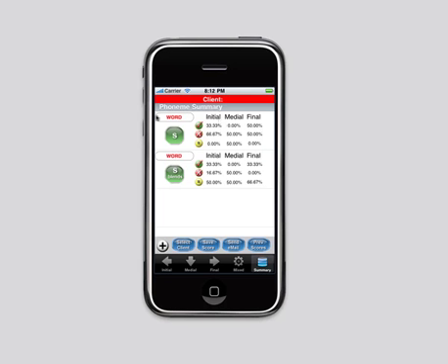Also, this is a new feature here of PocketSLP. Now indicates that this was done at the word position. We also offer the sentence at the sentence level, which we will demonstrate here in a little while. You notice up here it says client, nothing there right now. Let's go ahead and select one.